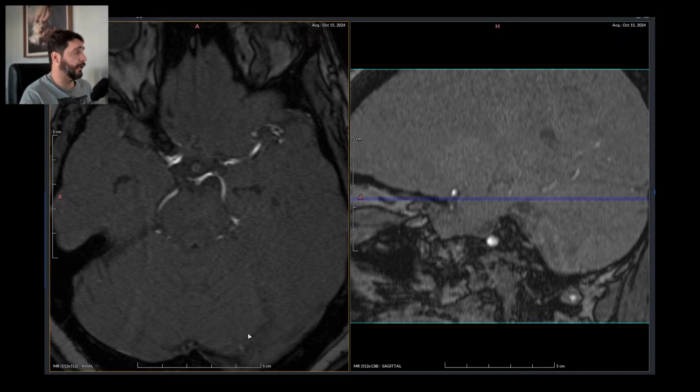I have a bunch of reports to do, a bunch of reads to do on low field MRIs of joints and bones. With joints and bones, we can probably get something out of the exams, but this same place insists on making brain scans and angiograms on a 0.3 Tesla old machine.